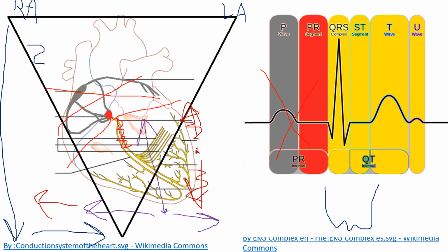One of the things that's interesting, and I don't fully understand it myself, is that your QRS is going to be linked with your T wave. It makes sense that when the electricity spreads over the heart and the heart resets itself, it's going to produce a shape. Now, could I predict the shape that's going to be produced by looking at the QRS? No, I can't quite predict that well.